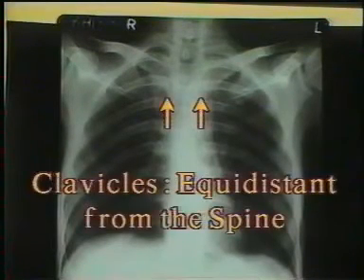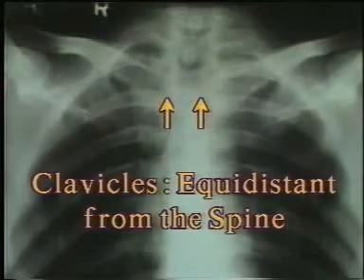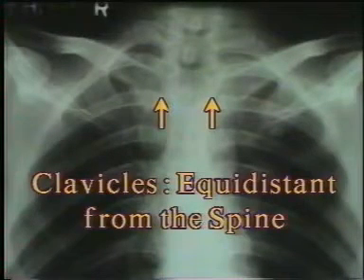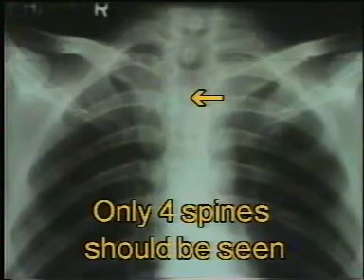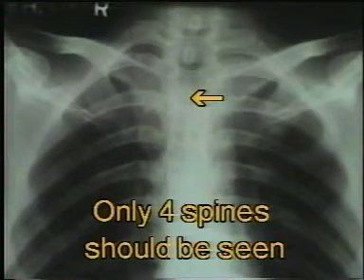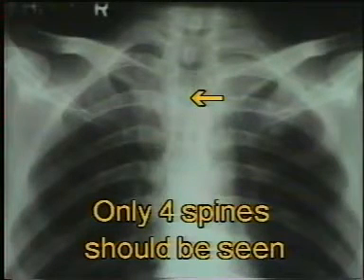In a well centralized film, the medial ends of both clavicles are equidistant from the spine. If they are not, then you cannot make any comment on the mediastinal shift, cardiomegaly, or on comparative radiolucency of the lung fields. In a well-exposed film, the spinous processes of only the first four thoracic vertebrae are seen. Others are hidden by the heart shadow. If the film is overexposed, more vertebrae are seen and the lungs appear more translucent.